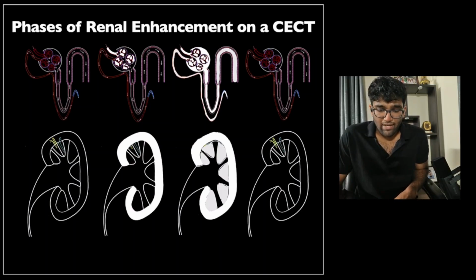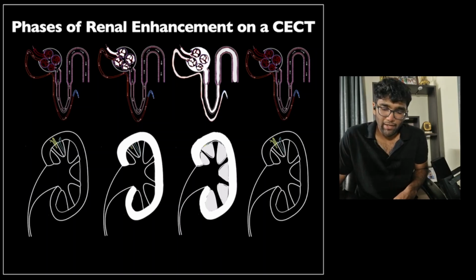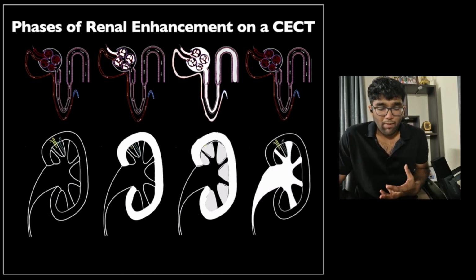That results in somewhat of an equalization between the cortex and the medulla, but there is still a difference. Finally, most of the contrast either goes away from the kidney via the venous flow, or it gets filtered and then accumulates within the collecting system, highlighting the collecting system. So we end up with these 4 phases of the kidney after contrast enhancement.